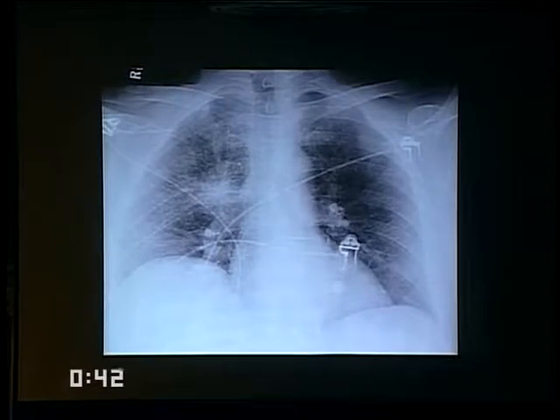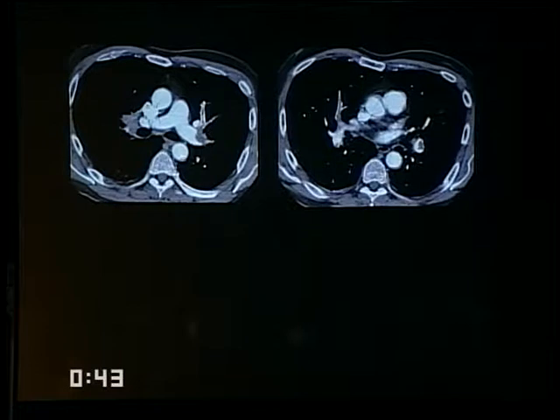The patients at greatest risk for pulmonary embolism often are those with underlying cancers and tumors. Here's a patient with an obvious lesion in the right upper lobe and large pulmonary emboli shown on the left side here. This is an example of where one can see it laid out in a vessel in profile. Most commonly we diagnose emboli in cross-section, and that's probably the most reliable way to do it. And one has to be a little bit careful. I'll show you some pitfall examples later of where an overlapping bronchus, particularly where there's motion, can simulate an embolus. But when one has a sharply defined vessel like this, it's pretty clear that thrombus is extending throughout.